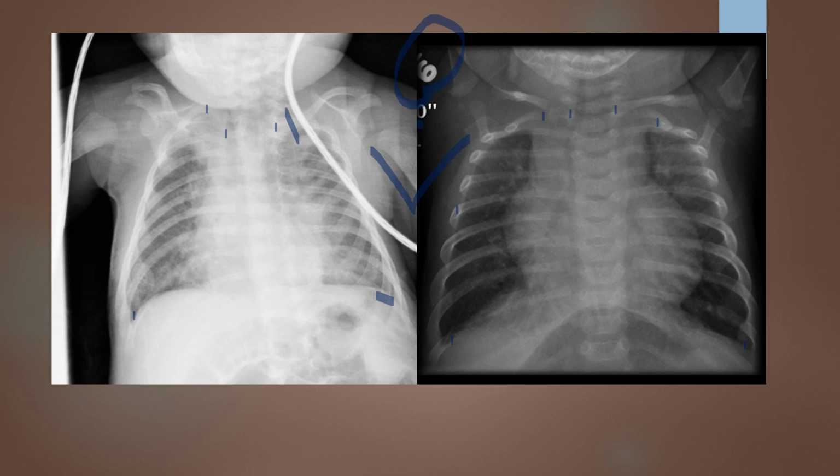This one is rotated slightly with the right SC joint distant to the spinal column, indicating that the patient was in a slightly RPO position. If I look at the patient's chin, their chin is looking that direction, indicating that the head might be turning the body that way. So this one's mandible could be raised as well, whereas this one's mandible is in pretty good position.